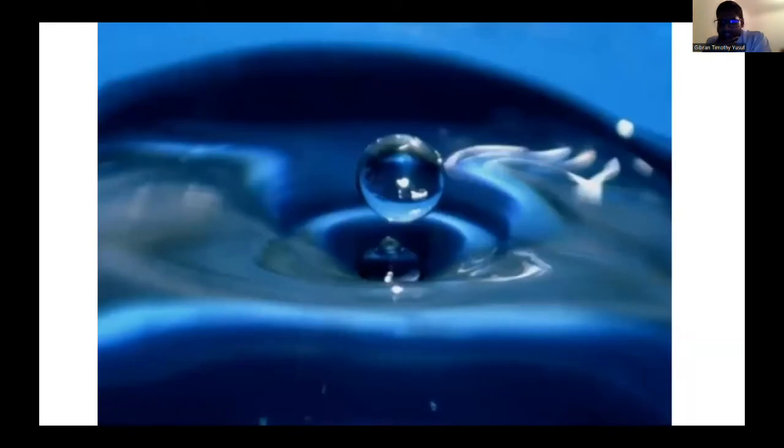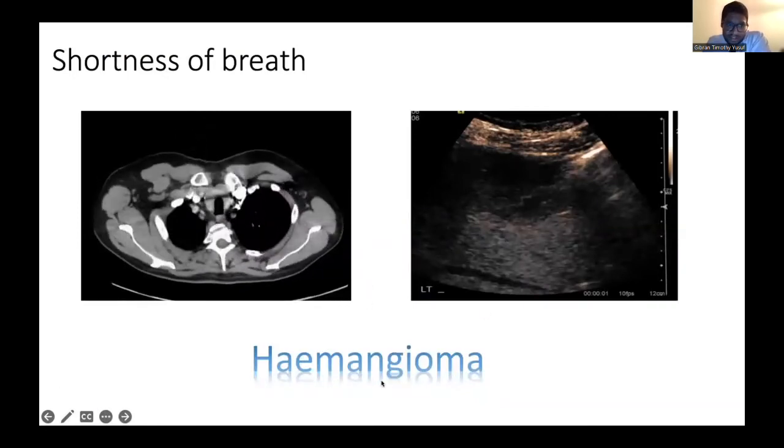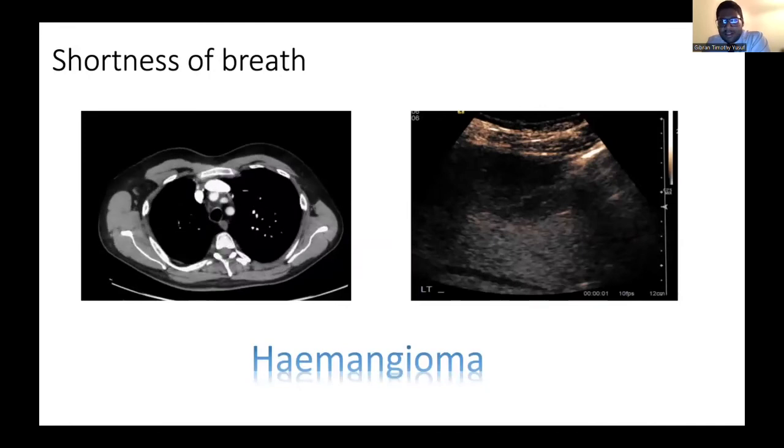So now I'll just briefly run through some case studies for you. I think I'm okay for time, am I? Yeah. So these are all quite interesting cases, I think. This is a chap who came in. You can see the CT scrolling there.